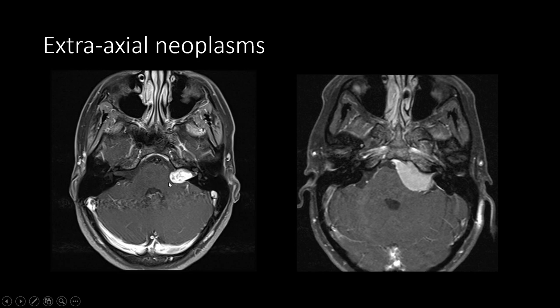And then, like I mentioned earlier, schwannomas can occasionally have cysts and hemorrhage, which are significantly less common with meningiomas. Meningiomas, on the other hand, are uncommonly centered directly on the axis of the internal auditory canal. They have a much broader dural base with dural tail. They very rarely will actually expand the internal auditory canal, and they can have hyperostosis of the adjacent bone. So those are some of the imaging features that can help distinguish between CP angle masses.